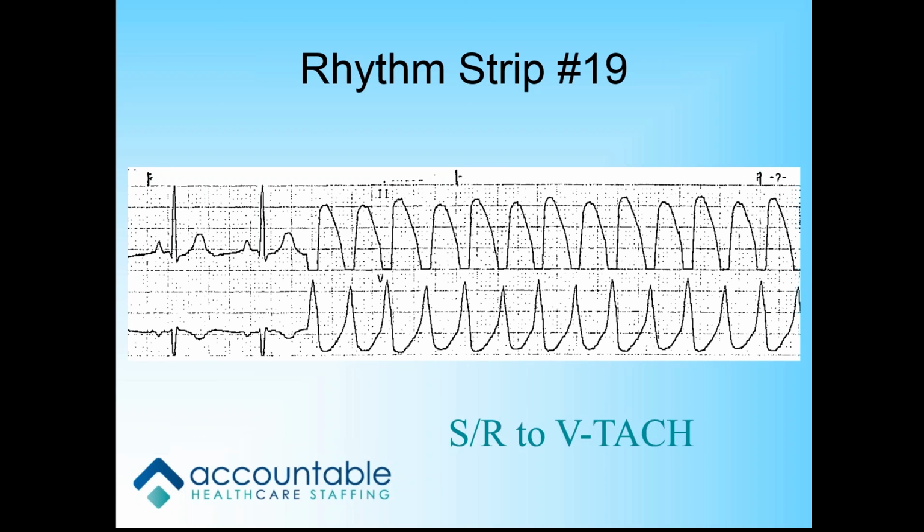Sinus rhythm to VTAC. One of the things to be certain of, this is multiple choice, but be sure that if they've got an answer that says sinus rhythm to VTAC, you choose that one because you're identifying. Okay? Perfect. Thank you. Next.